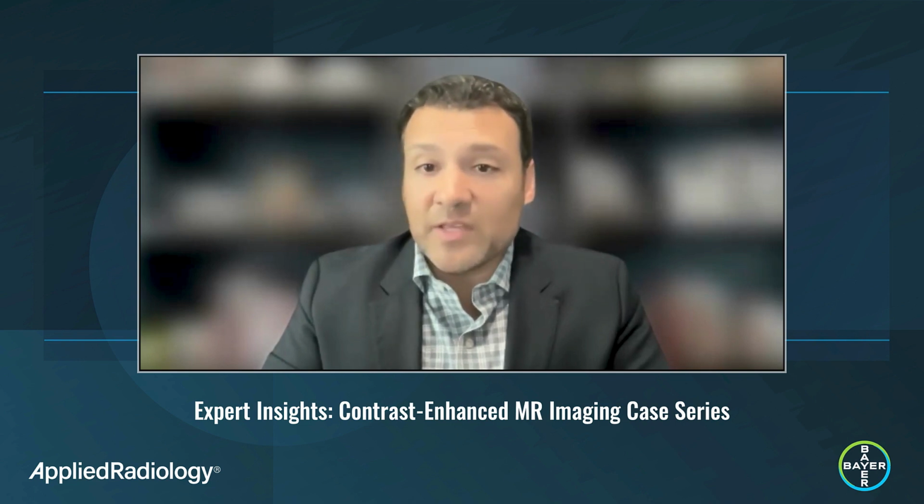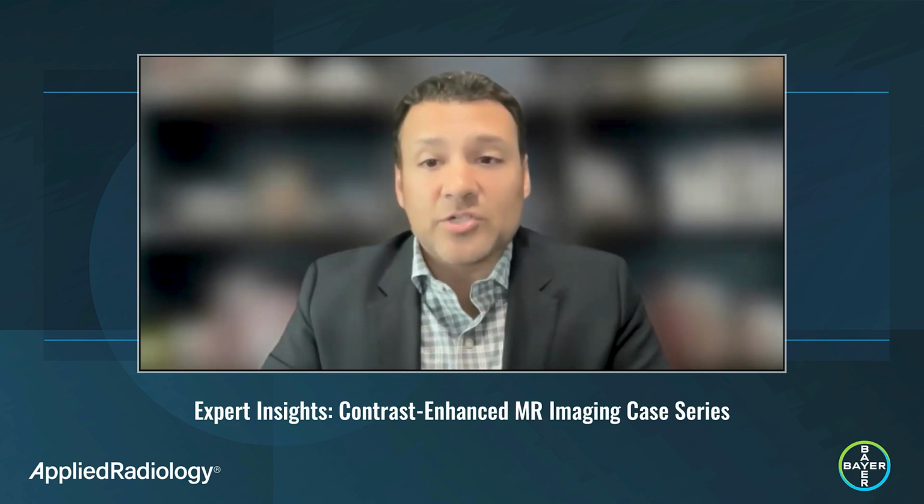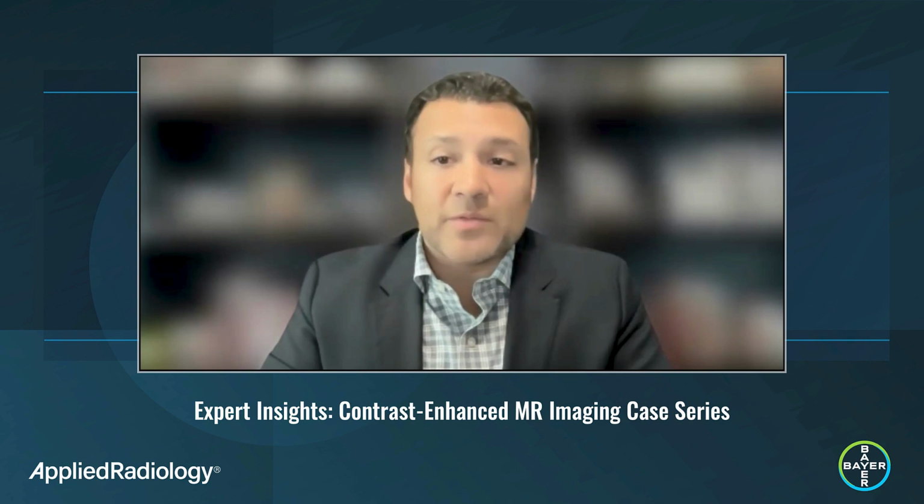One appealing aspect of the agent for me is that EOVIST dose is delivered in half the volume of an extracellular gadolinium-based contrast, which are typically dosed at 0.2 milliliters per kilogram of body weight, and EOVIST also contains approximately a quarter of the dose of gadolinium. I've used this agent in my practice for over 15 years and hope that the cases that I'm going to show you today will help you see some of the reasons why I've chosen to implement it in my practice.